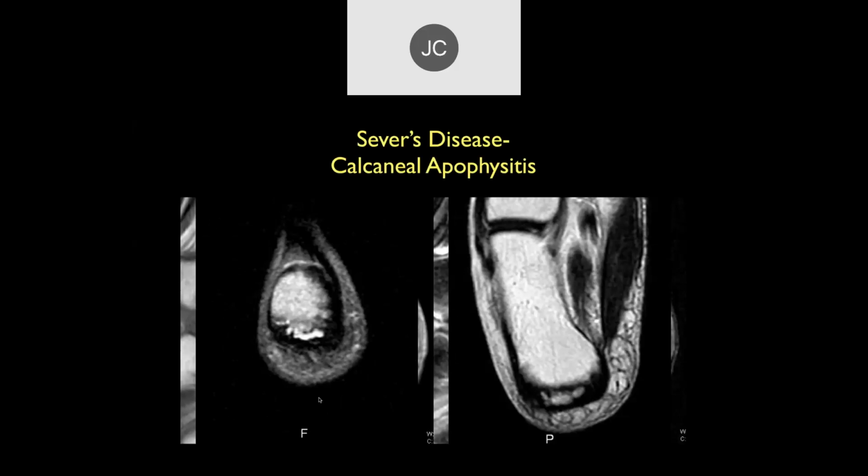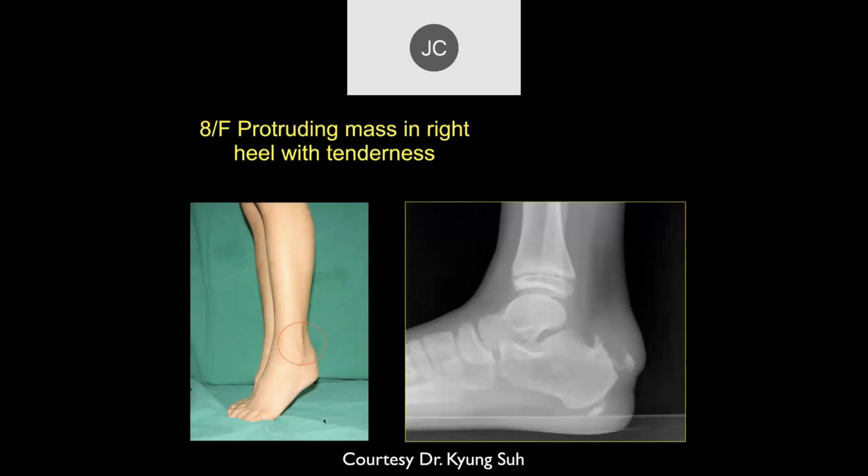Yeah, and this is called Sever's disease. It's also called calcaneal apophysitis, which is also probably a traumatic injury due to chronic stress and traction injuries, because the Achilles tendon comes down and a lot of those fibers also extend down into the area of the plantar fascia. So, especially in younger people, this is a common area where overuse can produce symptoms in patients. So that was Sever's disease, which is traction injury of these structures of the apophysis and the fibrous attachments to the apophysis from the Achilles and the plantar fascia.